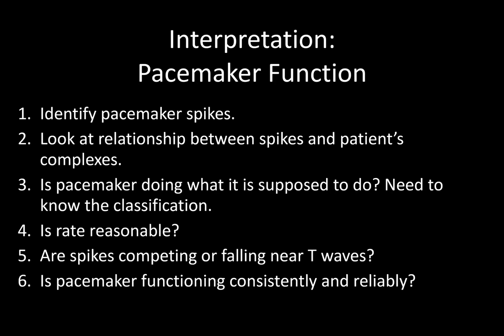So now that I've introduced you to the terminology regarding pacemakers, how do you evaluate someone's pacemaking to see if it's working the way it's supposed to? So here are the steps. It's not unlike what we've done prior with going through any of our strips. It just has a few different things that you need to focus on. First off, you're going to identify the pacemaker spikes, and sometimes they're very small.